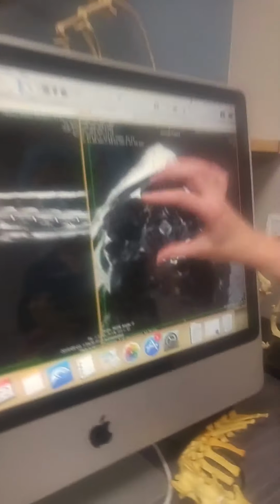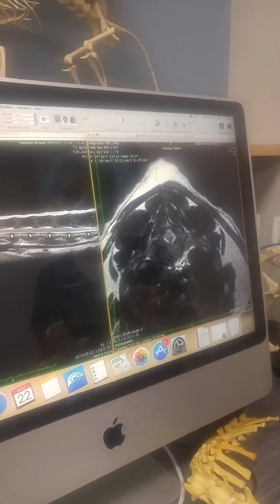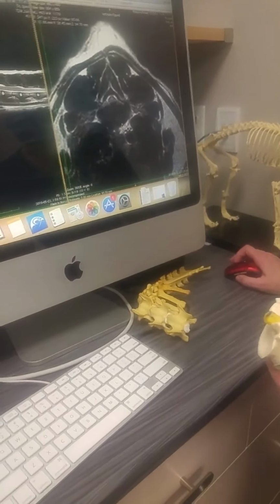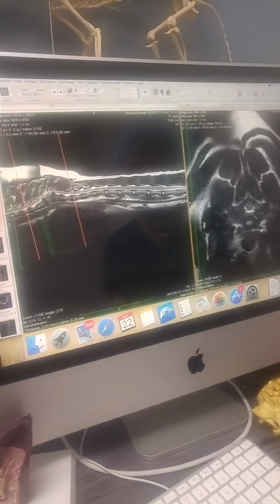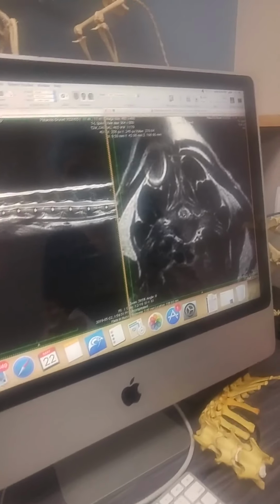And here we see that the shape of the bone around is not perfect. So that's more because of that that we have a compression, if that makes sense. Because if this is misshapen, then it can put a little bit more pressure on that disc, and that can cause a little bit of bulging as well. Okay, but the other thing that we're going to do, and I'll come with the options in a second, I just wanted to show you that area of the spinal cord is not as nice and round.